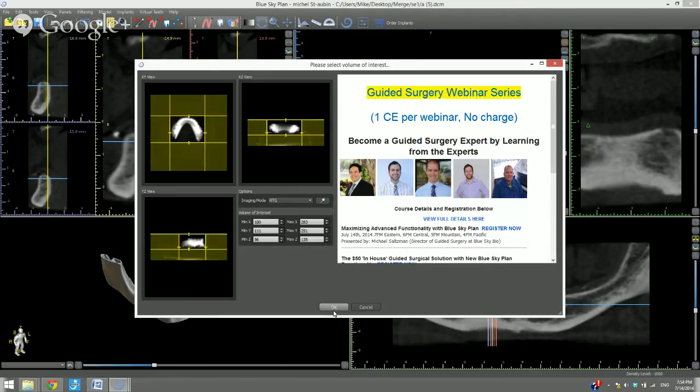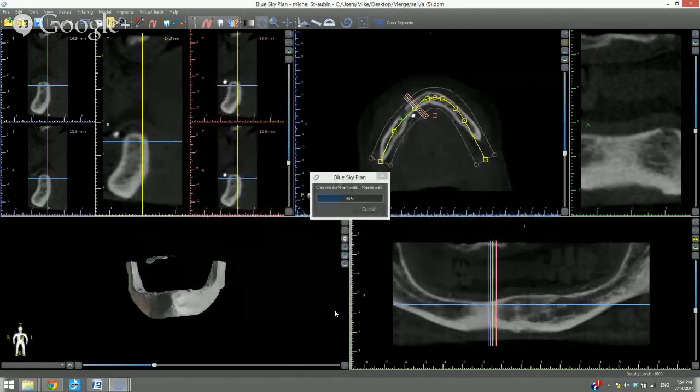for a computer to process 2 sets of DICOM images requires a lot of the computer's resources, and we want to minimize the work for the computer. The software runs through a couple different processing stages.